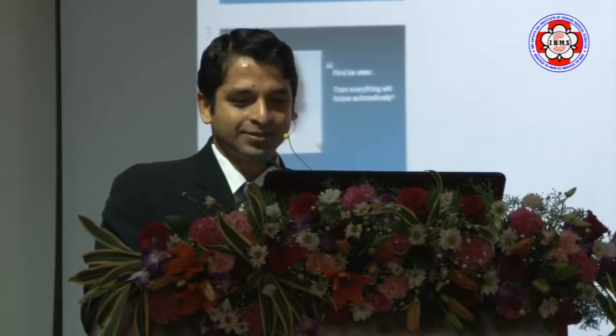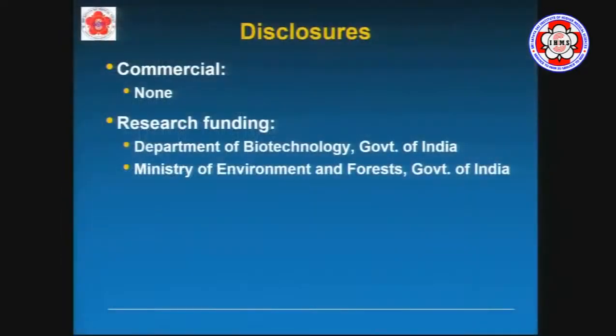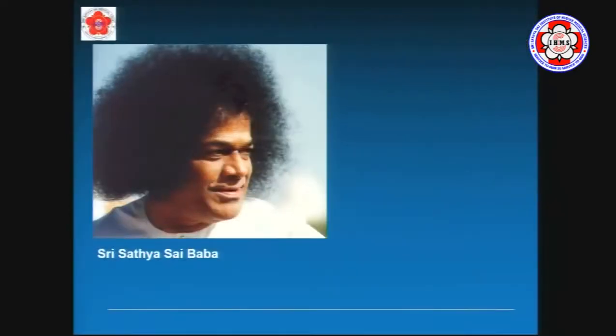It's a great pleasure to be here and to talk to you about what we do from the non-invasive imaging side, that is echocardiographic evaluation of the mitral valve. I have no disclosures, but as I was putting this talk together, I was thinking, when it comes to the mitral valve by echo, there are at least some 50 odd parameters that we use to describe the mitral valve, the valve severity, the valve anatomy, and importantly for this audience, those echocardiographic parameters that predict successful repair or not. So that's a lot of things.